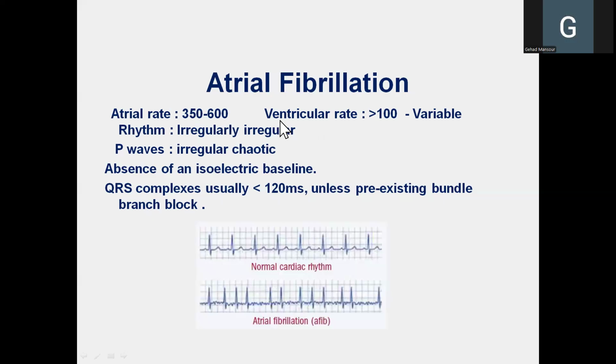node. But if you notice the ventricular rate, it's true that the ventricular rate is higher than normal, it's higher than 100, which is similar to tachycardia, but it's not true tachycardia, and I'll be saying why. But the impulses have passed from the atria to the ventricles across the AV node normally. Why? Despite the presence of an ectopic focus, because the focus is in the atria. So in order to pass to the ventricles, it has to pass through the AV node. It does not have another pathway to pass through.